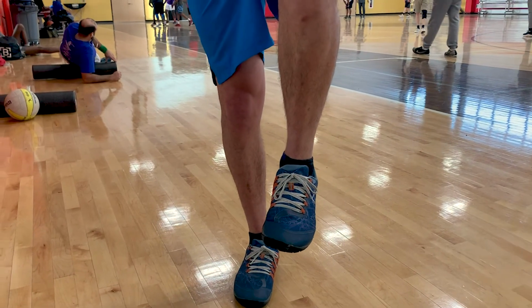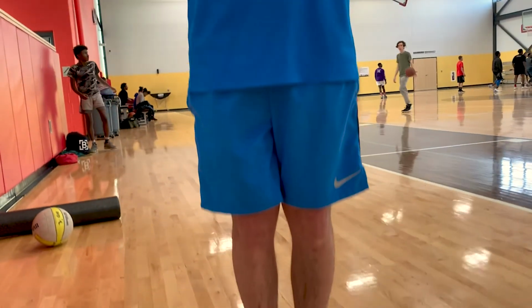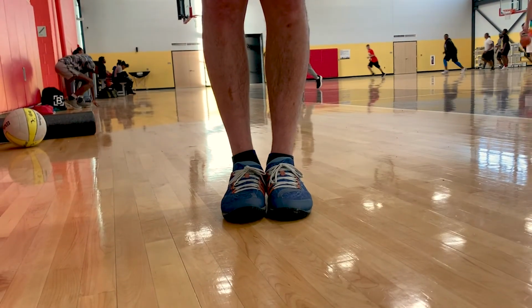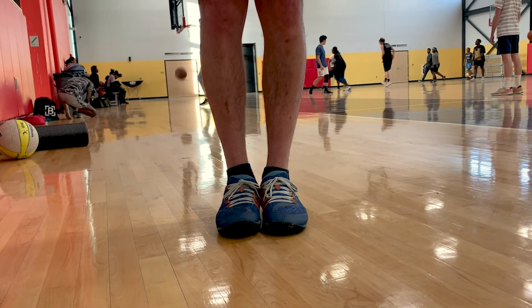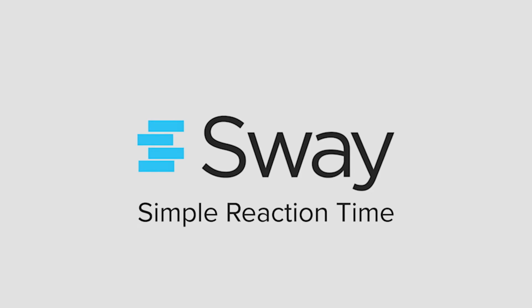Make sure athletes are not holding the device away from their body or using one hand to try and keep their balance. Each balance test should take roughly 10 seconds to complete. The phone will let you know when the test is finished by flashing a light, vibrating, and if the volume is turned on, making a noise.